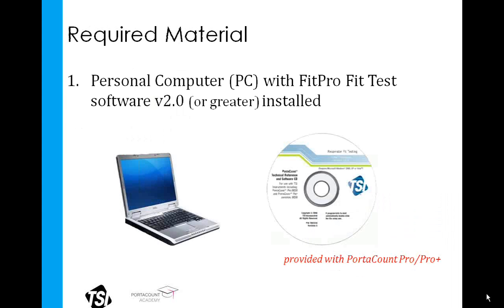Now, it may be helpful for you to follow along as we go through this course. If you do have another laptop or another computer that you're going to follow along with, go ahead and power that on now. But we do want to make sure that we've got a computer with the FitPro software installed on it in order to proceed with following through.